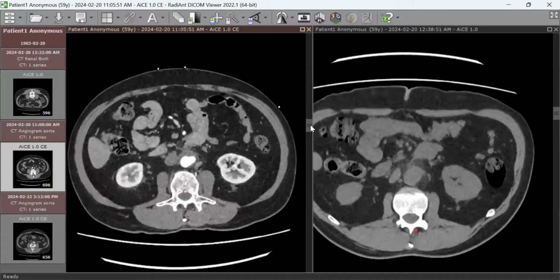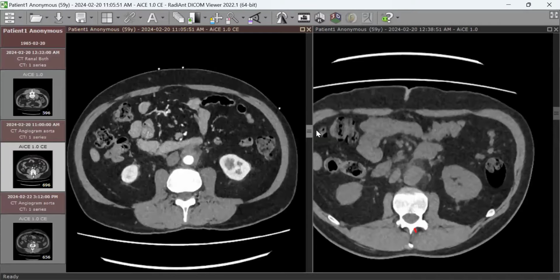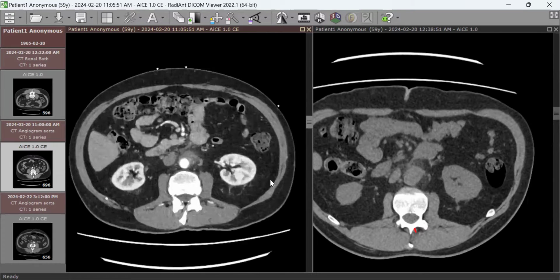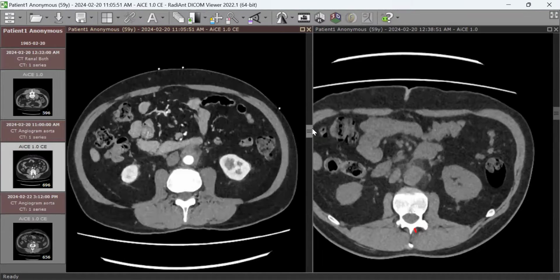Okay, so there is a saccular outpouching of the abdominal aorta at the infrarenal level, surrounded with fluid and lymph nodes, possibly a mycotic aneurysm. Okay, that's great, excellent. First we said there's a possibility of an atherosclerotic penetrating ulcer, but the patient doesn't have any significant atherosclerotic process looking at both scans. And the findings of fat stranding, fluid, and lymph nodes also go with mycotic aneurysm, right?